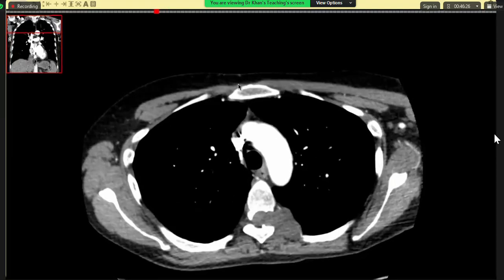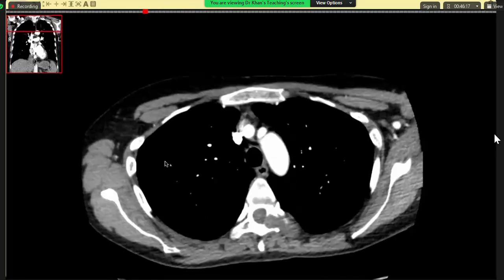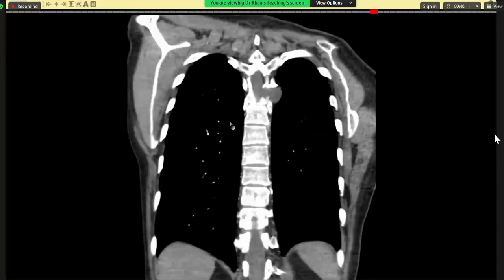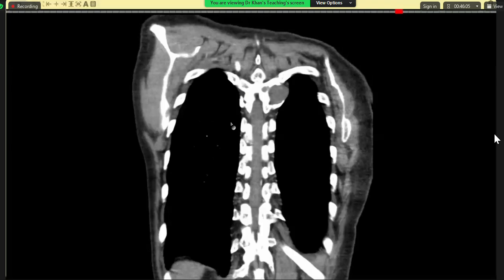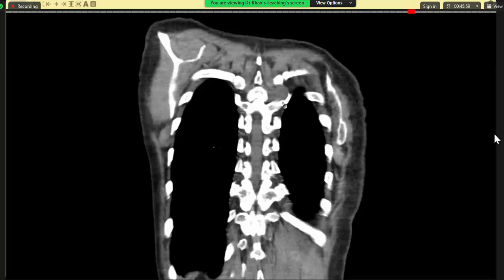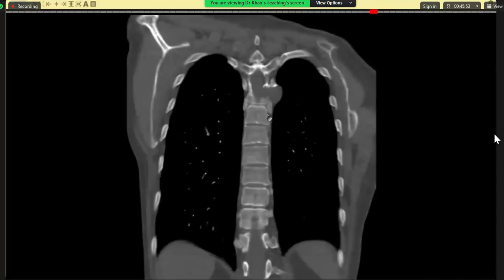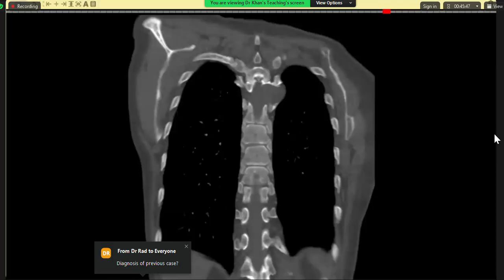And this axial is a CT scan in which we can see that there is a lesion here. And this lesion, if we can see on a coronal, which one can ask a coronal also. So part of it is causing inferior, this is the transverse process, and this is superior rib notching also. Here you are. So that kind of picture you can see, and it becomes a simple case.